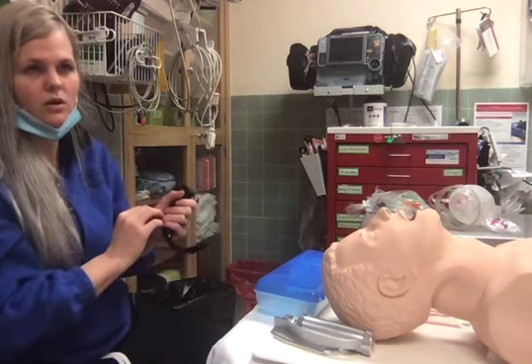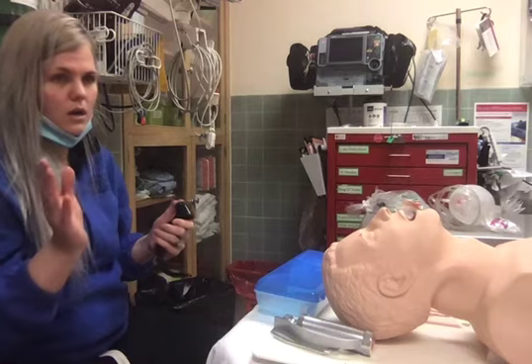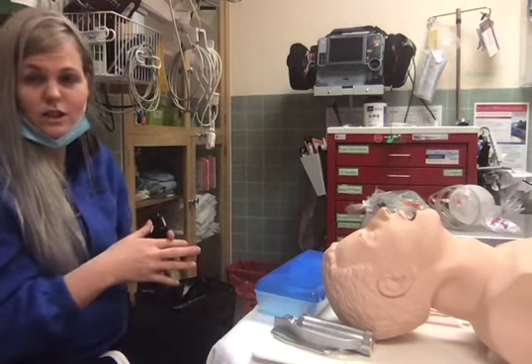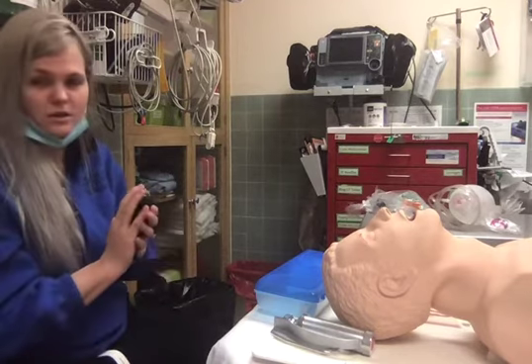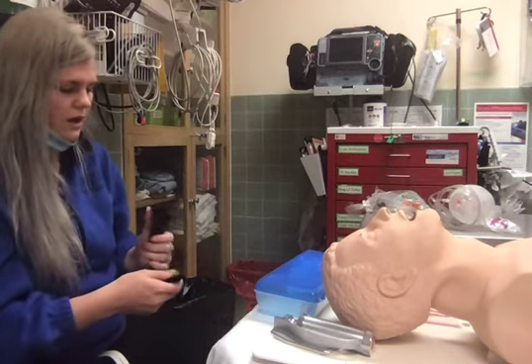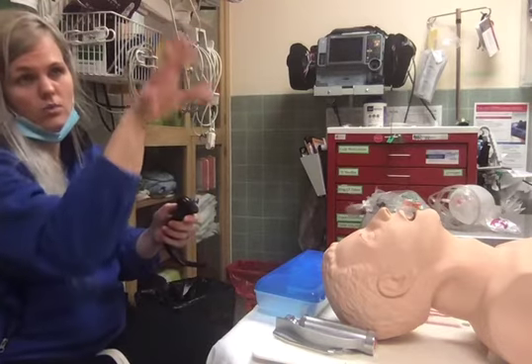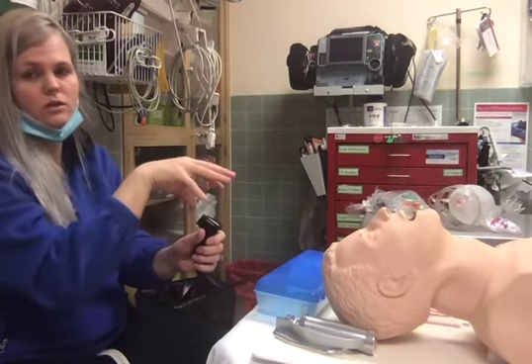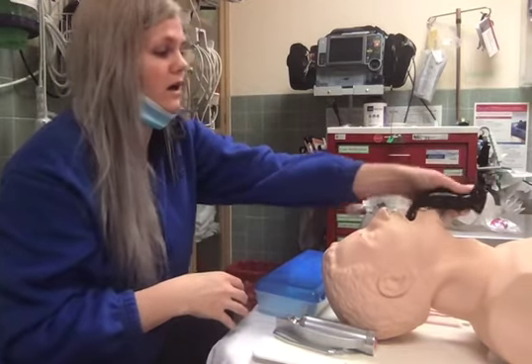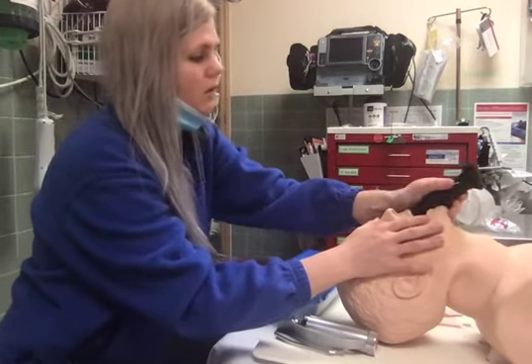Also, people use what's called glide scopes. Glide scope goes, depending on your facility or your ambulance. We can also use the King Vision, which is very helpful. I personally like the glide scope just because I feel like you get better visualization with it. Again, that's used kind of like the blade, except you would have this attached to either your monitor in the emergency room, or there's actually a little video that sits on top of these. And again, that just goes in the same way. This is a 3, so this is actually an appropriately sized option.